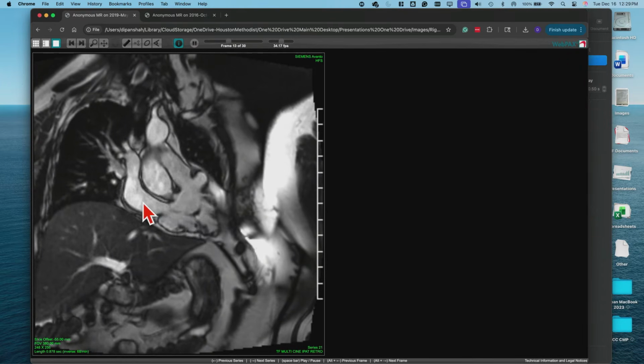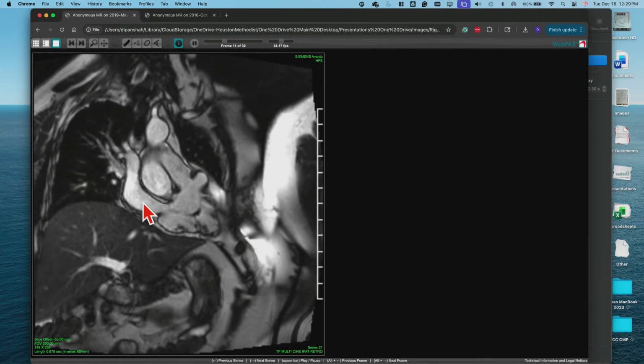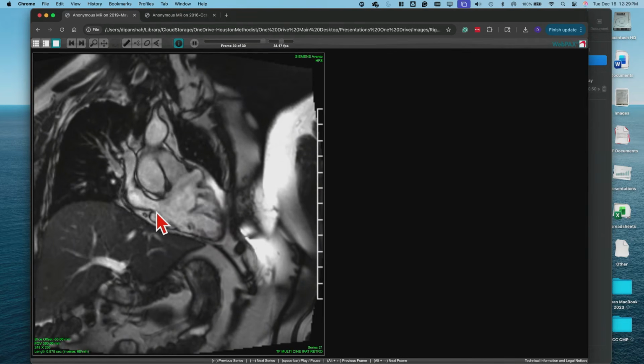No, on this view, you don't want to look at that because, depending upon where you did the cut, it actually looks small, if anything, but where you did the cut can affect it, right? Because if you're not going through the center of it. So I'm going to draw your attention more to not the inflow, but look at the outflow.